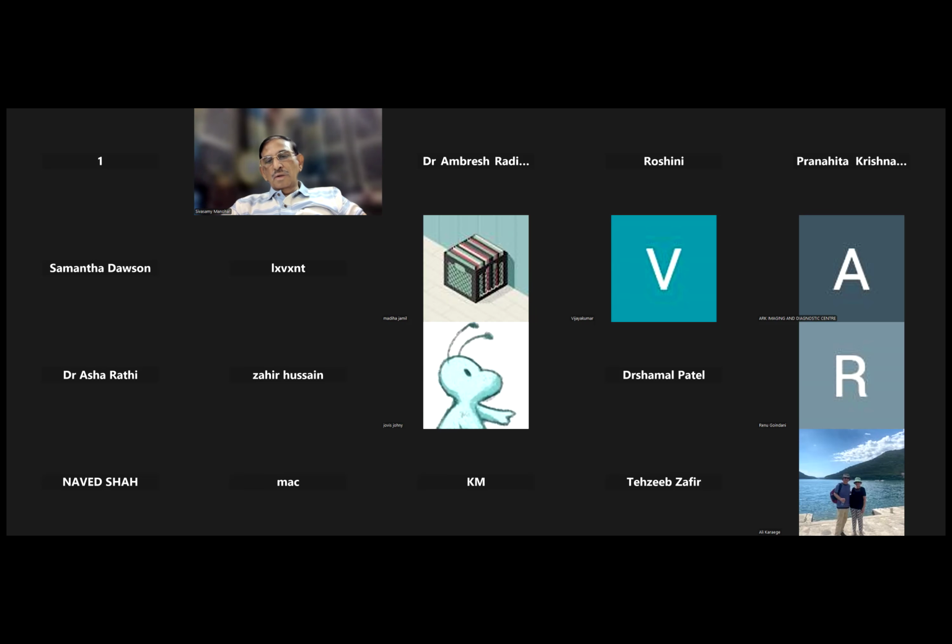So that's what the next question is also, clinodactyly is seen often. What to report? You say that there's a clinodactyly and ask them to work up for Down syndrome in case you are seeing other stigmata of Down syndrome. In one of our cases, there was a clinodactyly, there was an absent nasal bone, there was echogenic bowel, plus I think increased nuchal fold. So that clearly points to Down syndrome. So isolated clinodactyly can be common. It is found in almost about 18% of normal fetuses.